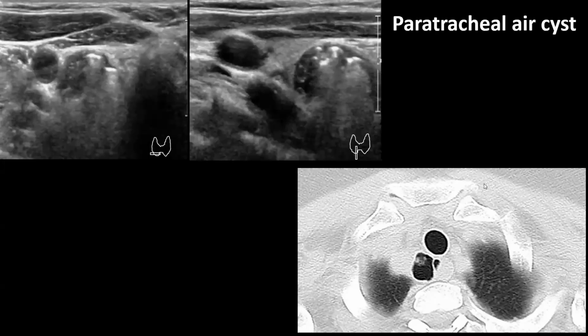An outside clinic's ultrasound revealed a calcified parathyroid mass. Ultrasound showed a mass in the lower part of the thyroid gland, and the internal hyperechoic foci showed ring-down artifact at the back, indicating air. The first thing you might think of is esophageal diverticulum, but the mass had no connection to the esophagus.